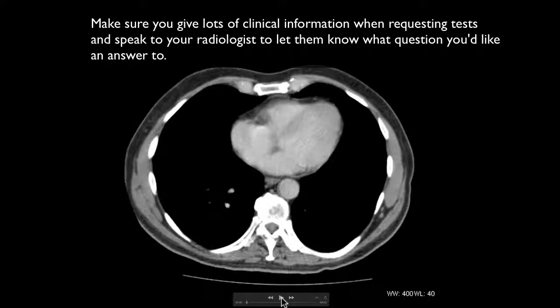Sometimes you don't need intravenous contrast. For example, if you're looking for renal stones, having the bright renal stone on the background of an unenhanced kidney is very easy to see. Whereas if you give contrast, it can paradoxically make it more difficult to make the right diagnosis. So it is absolutely critical. You're not just being grumpy, it actually makes a difference to what you do and the result you get in treating the patient. So some of the time we're not being grumpy. That's right, only some of the time.